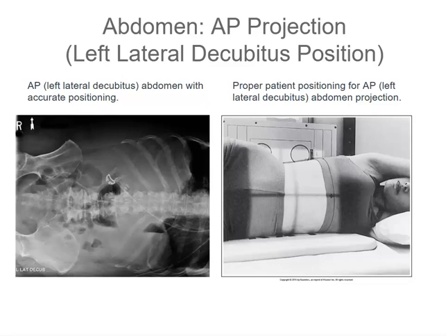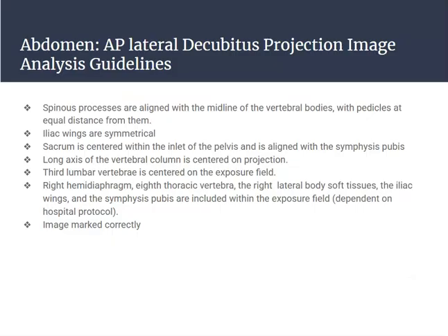The diaphragm domes are located superior to the ninth posterior rib when the exposure is taken on full suspended expiration. Here are those image analysis guidelines for your review.